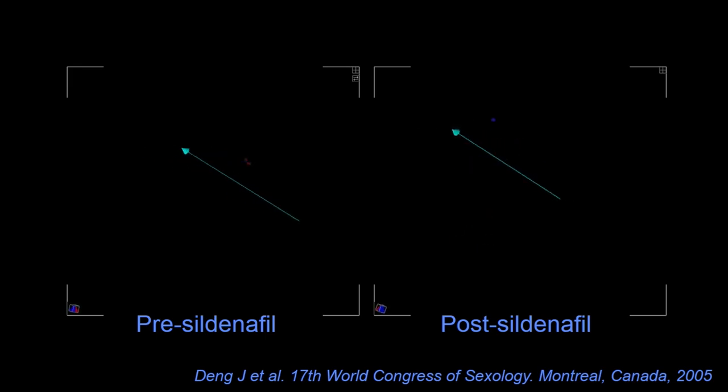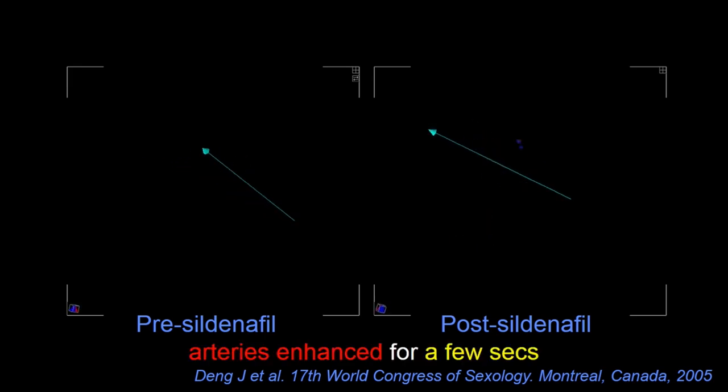But the problem is that the artery enhancement only lasts a few seconds, and a sweep takes at least 5, 7, or even 15 seconds. So without a real-time quick scan, you might miss another part of the deep artery enhancement and draw a wrong conclusion, say that the patient has a one-sided artery defect, which is not the case shown here.